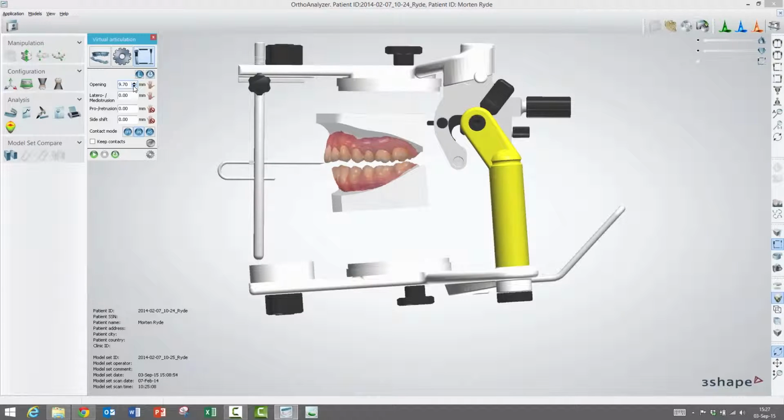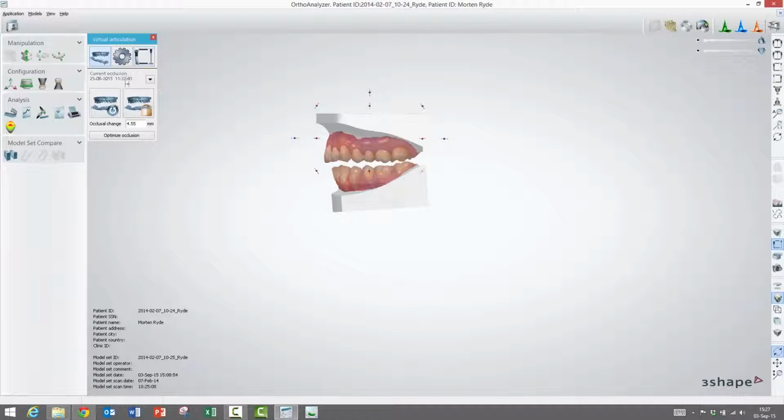There's one tricky part here. In order to lock the position, the current new position, you will have to return into modify alignment of the jaw to lock. So back to that one and then use the lock like we had before.